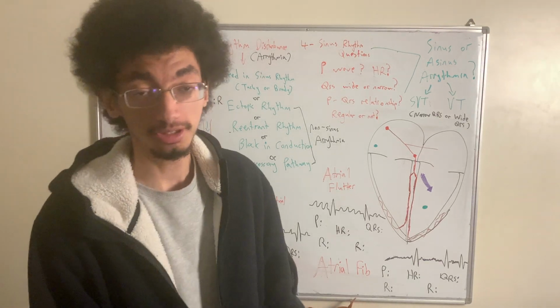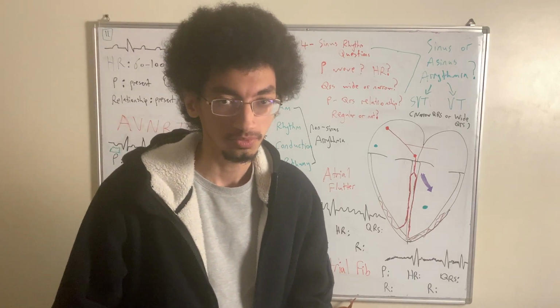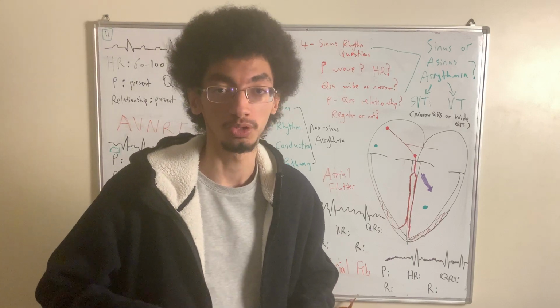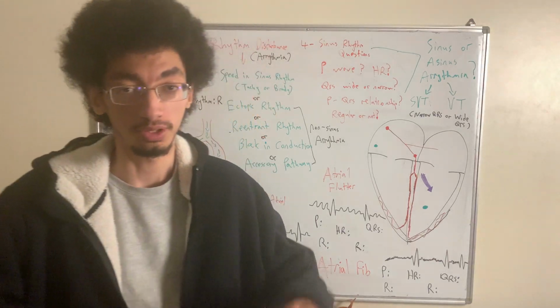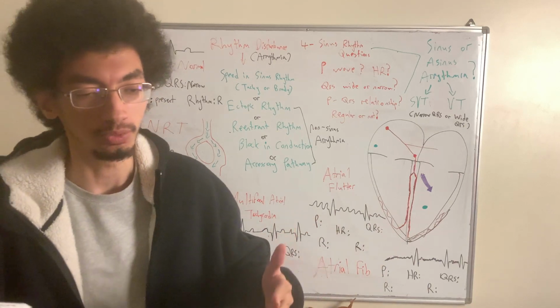All right, so let's talk about the other abnormalities that we can search for on an EKG. By far the most common abnormalities that you can find on an EKG, the most important bits, are arrhythmias. So to revise from previous videos and developing our 9-step search pattern, let's stop at 8, but eventually we'll come to that.